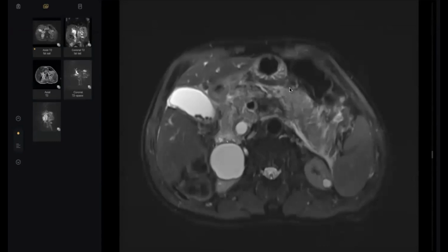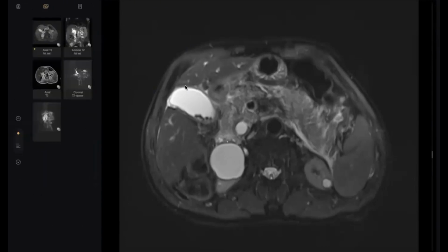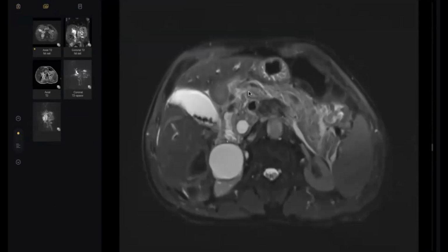Hello, sir. Hello. I think it is request control. I think this is the same case. Okay, one second. Different case. Request control, doctor, please. Okay, requested. Okay, so I've been presented with a 75-year-old male patient with jaundice. One second. Hello, go on.